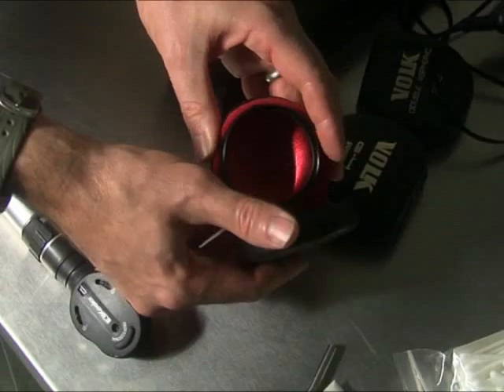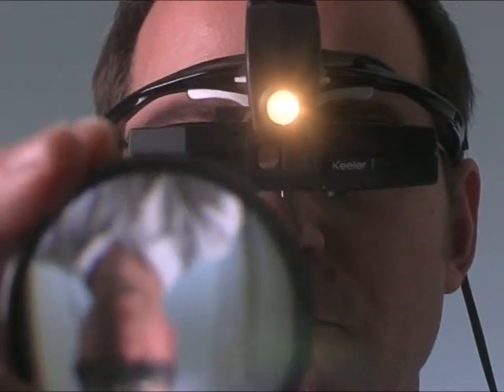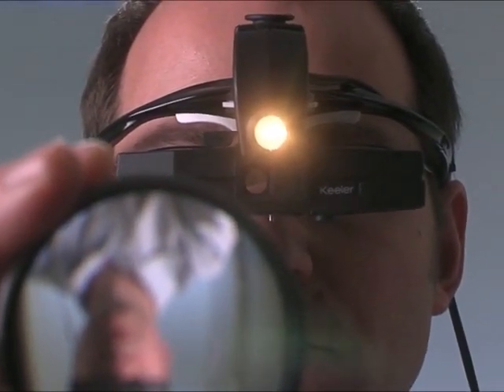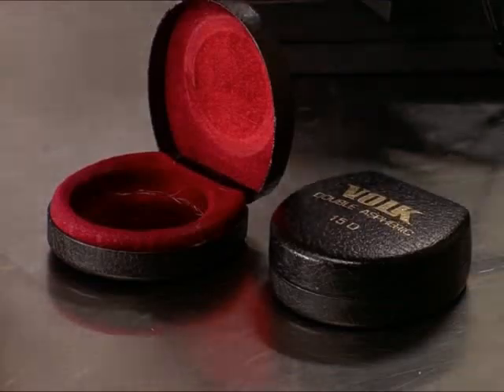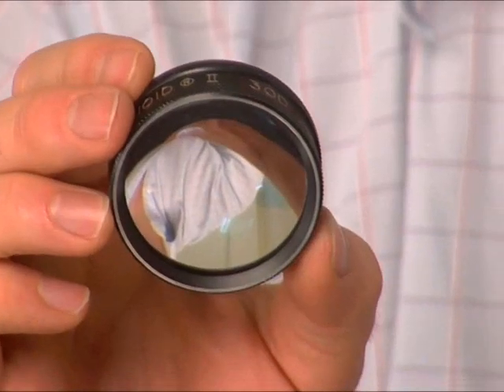Lenses used for indirect ophthalmoscopy are identified by their diopter value, which describes their refractive power. I think when you're starting out, the best recommendation would be to get a lens that's easy to use. So quite an easy lens to start out with is the 30 diopter lens. But as you can see here, it's a reasonably small lens. You get a large field of view, but you do lose magnification.